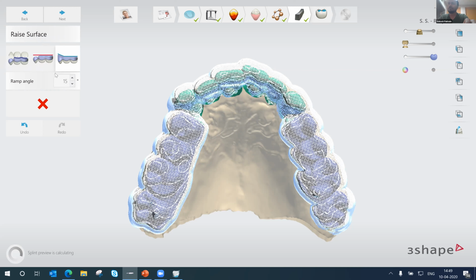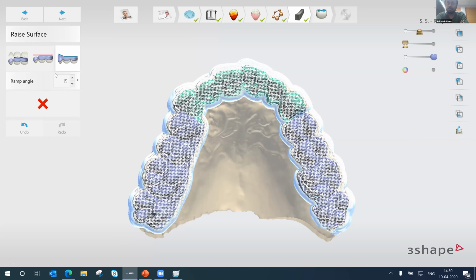I believe plenty of you must have started using the Splint Studio, and you must have come across different thoughts and everything. But definitely, we are still improving all the settings and other things in this Splint. Anyways, I feel this is a much more top version right now, but there are still some improvements going on, and we would like to take your initiatives as well for that.